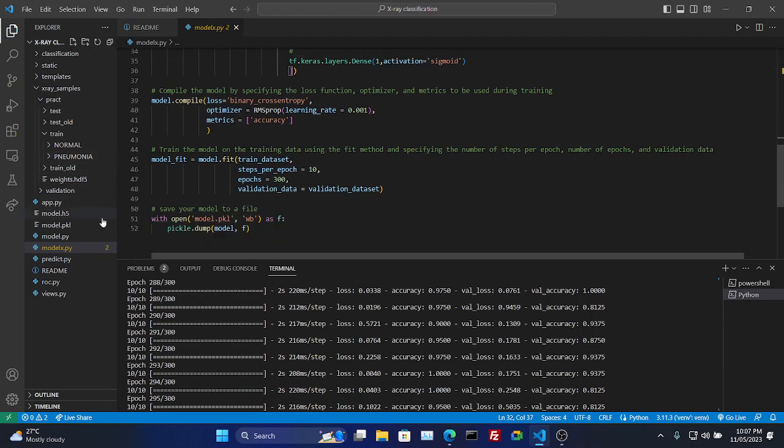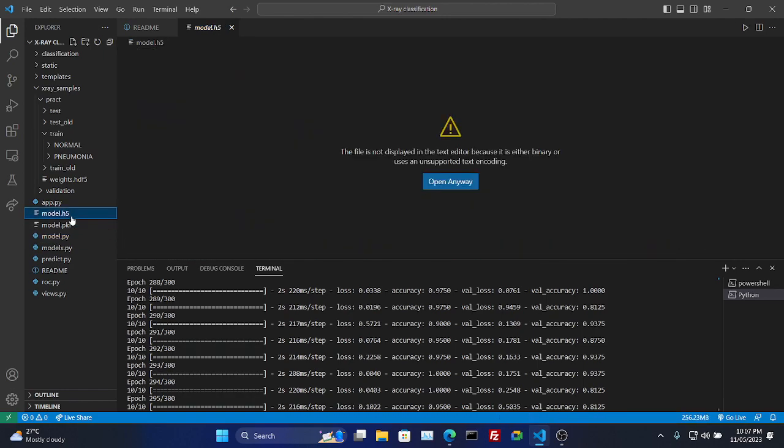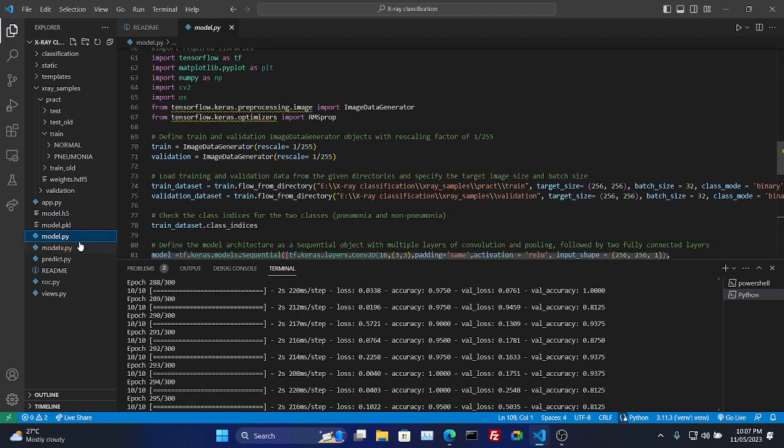We trained with two different formats. We saved our model with .h5 format and one with .pickle to test out the difference in their accuracy for our testing data. For some instances, the .h5 format proved better, while in other instances, the .pickle format proved better. It mostly depended on the severity of the pneumonia in many of the X-rays. After training our model, we evaluated its performance using several performance metrics, including accuracy and precision.